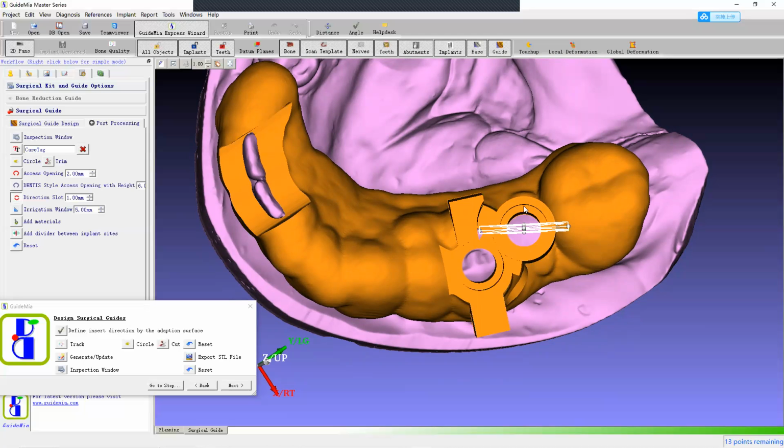As you can tell, when we place an implant, our yellow line, the longer yellow line, is probably this way. So we end up with this slot direction. If when we place an implant, we correct the yellow line direction this way, then the slot will go like that. So right now, this is not a perfect orientation, of course.